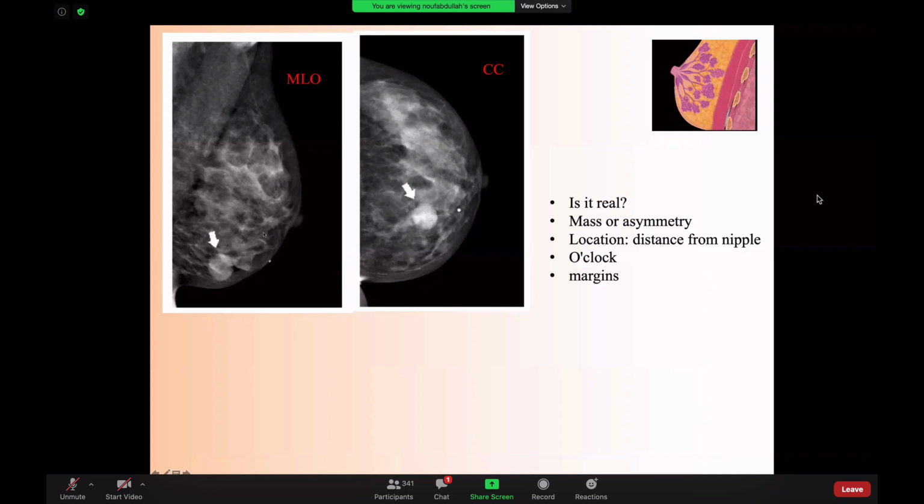So if I do my true lateral, we said muffin rise, muffin, medial. So a medially located lesion will go a little bit up here, okay? So it is medial, a little bit here. However, it is still below the nipple line, so I am dealing with a medial inferior left breast mass. So imagine the left breast as a clock location, left medial inferior, so it is from 6 o'clock to 9 o'clock of the left breast. Most likely, I will find it at 8 o'clock.